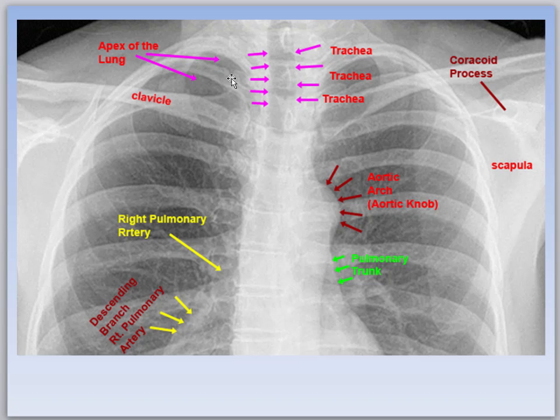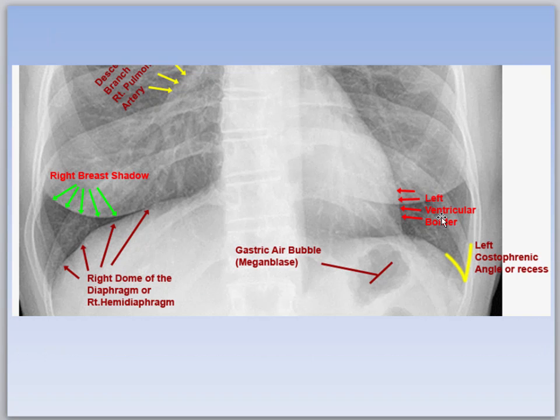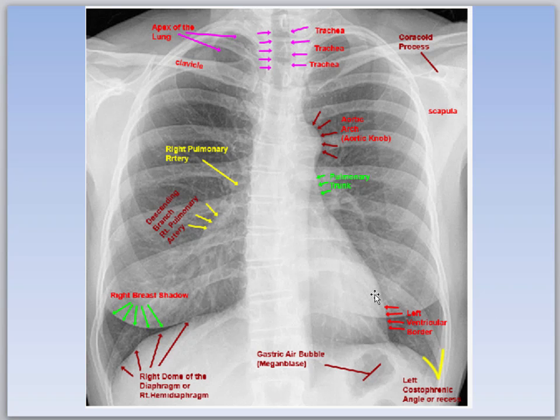What was that? That should be artery, of course, not ritery. Aortic knob. Okay. There's a picture of the lower region. I think we went over everything here. Looks good. There's the whole ball of wax.